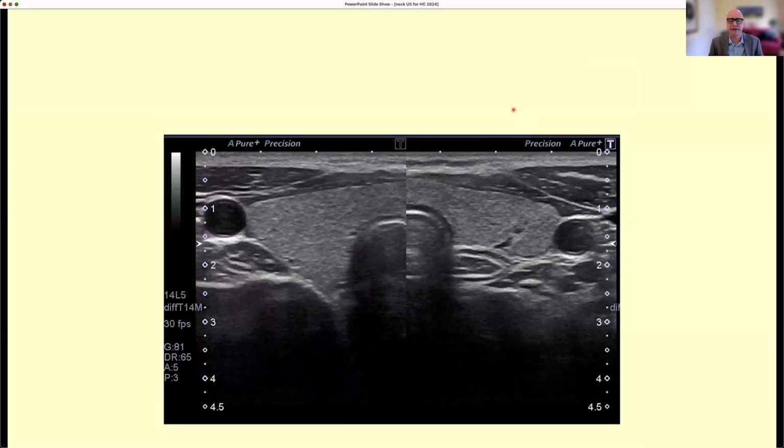So here we have a composite image of the two lobes of the thyroid on a transverse image. I want to start here, and ask people, again, that nice gray zone, etc. I want to start people identifying the other structures that you can see. For example, what is this? Anybody want to volunteer, break the ice?